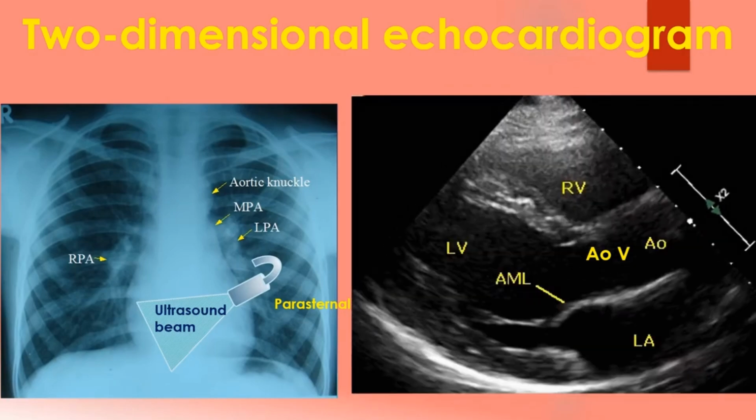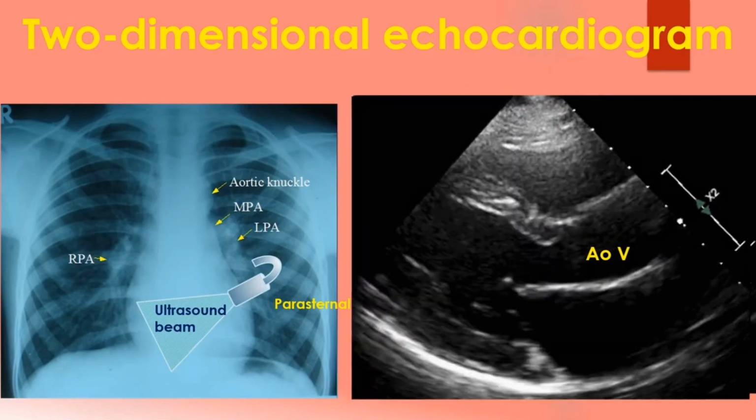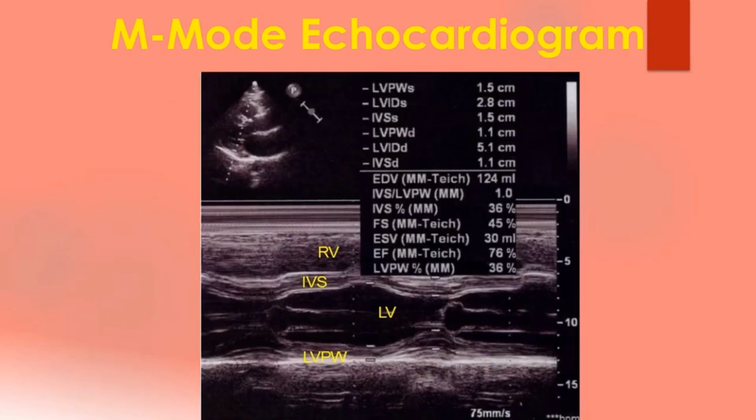The image shown here is an animated two-dimensional echocardiogram. This one is an older mode known as time motion mode or M-mode echocardiogram. Unlike the previous two-dimensional imaging, this is a single-dimensional imaging. Movement of the structures along a single scan line are depicted as a horizontal graph. Though it is the oldest mode of echocardiography, it is still being used for taking measurements of the left ventricle.